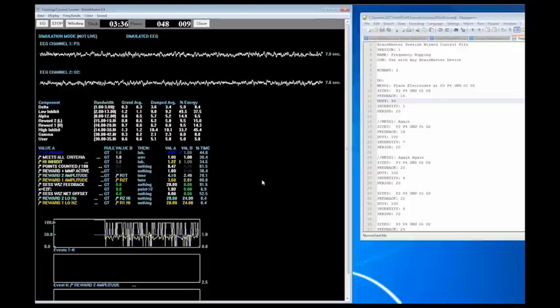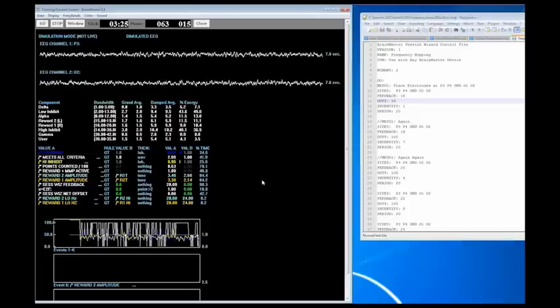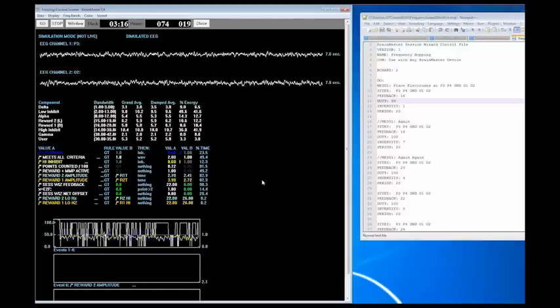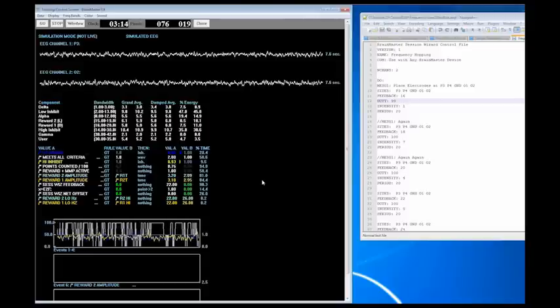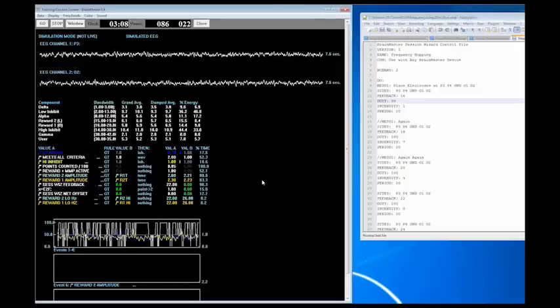Now a couple of these other ones are also giving you points and showing how each area is doing, and that's what it's designed on. I wanted to show you guys this more to show it to you. They can use whatever they want on that. You can still use the basic feedback on it. We have it activated so it works with multimedia player and flash player and anything like that. It would be whatever you want your client to be working with.